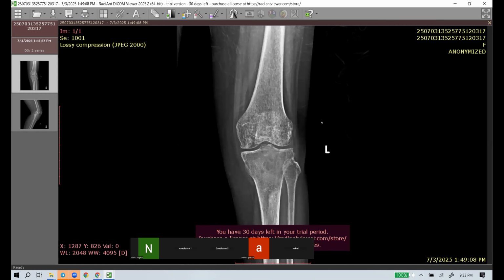So this is a 50-year-old who has come with pain in the knee. Okay, I've been provided with the X-ray of the left knee joint, AP view. At the first instance, I can see there are some ill-defined lucencies or lytic areas in the proximal tibia with narrow zone of transition. Multiple lucencies are noted in this region. There is also some irregularity of the medial proximal margin of the tibia.